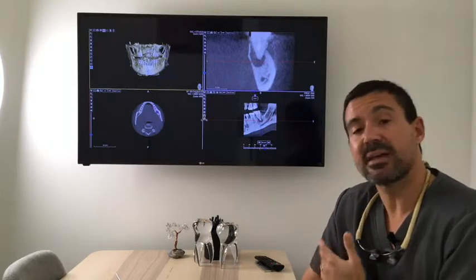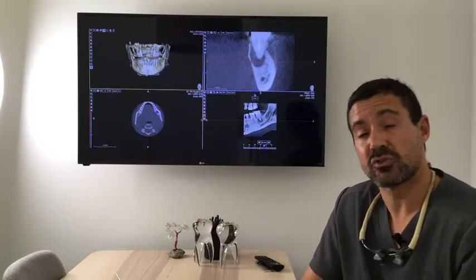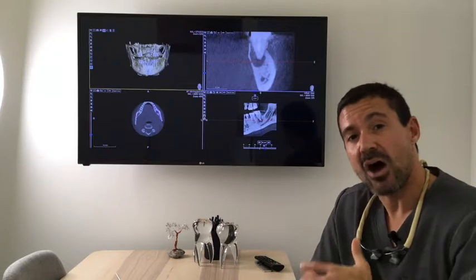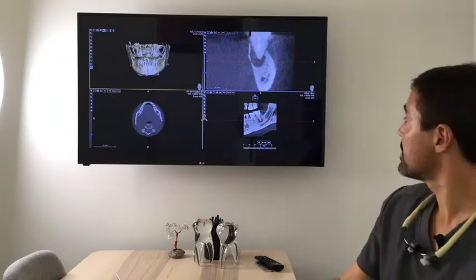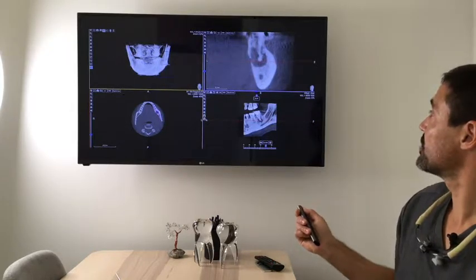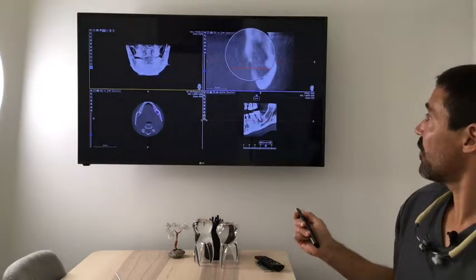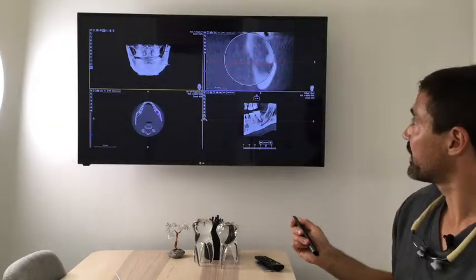Because when I see those clinical pictures, it might represent that there is some drainage out of the cyst area that is draining somewhere. So if I take another cross section and I see this cross section, this is where I wanted to reach. I wanted to get here. See how the lingual plate is really thin, and see how the lingual plate basically is completely broken?